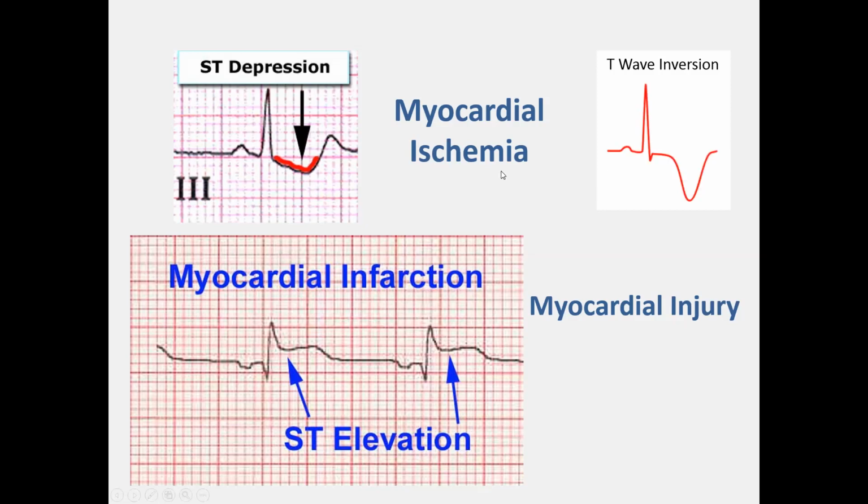But now you sit down and rest, or you take your nitro and it goes away. What's that Holter monitor going to do? This ST segment will come back up to the baseline. It will be isoelectric, and this T wave will turn upright. These are reversible. If you get oxygen to the heart, these are reversible.